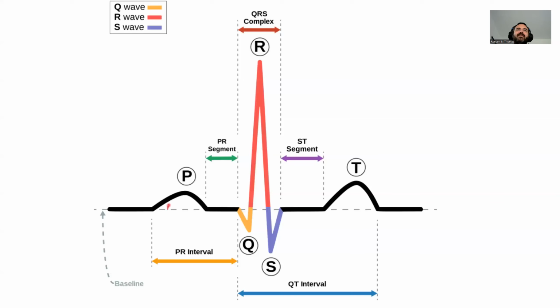You're going to see almost constant P waves. They're not going to look like nice P waves. There's going to be constant little jaggedy or even wavy lines, then a QRS, and then maybe you'll see a T wave, right? The thing to think about is when you see those little P waves, those half P waves, or fibrillating of the atria, you're going to see them, and then you're going to see a big QRS.